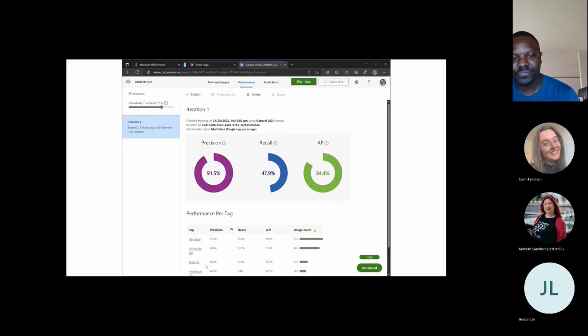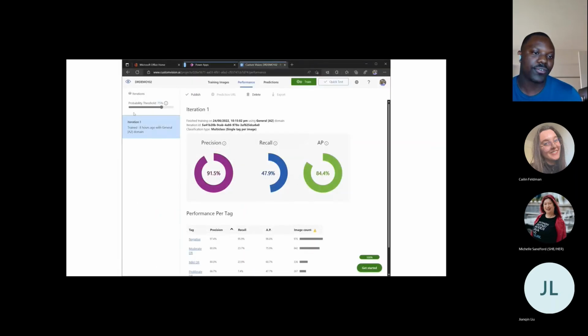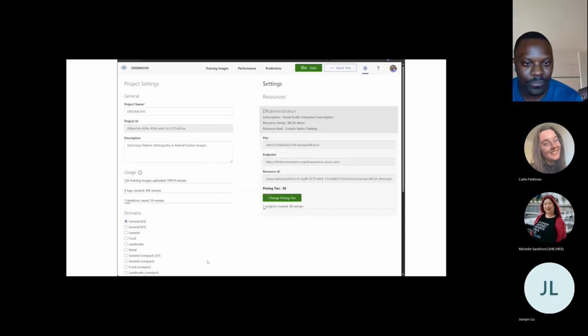And so after that, I could have shown this. I'll just show it from this side as well. Just mindful of time. Once we are satisfied with the model, we'd use the prediction. You'd publish it, and then do we have a link to actually show how to hit the publish? Yeah. So there's a publish button there, and once you press that, you can publish it. You can then access your APIs, which will allow you to connect with the Powerapps service. So when you get to the Powerapps side, I'll show you what we actually need on this side.